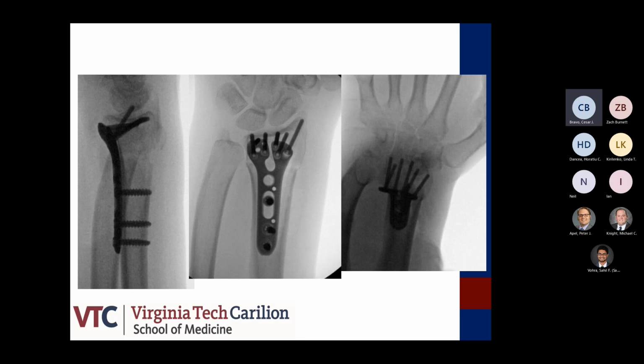Yeah, and the other thing is, if you look at that center hole screw, the locking screw there, I do put that locking screw. There's actually 2 biomechanical studies that look when they've got that metaphyseal diaphyseal comminution, just to put the locking screw, even if you get a unicortical fixation because of the dorsal comminution, because the stresses with this plate, because it's a leaf plate, are pretty significant there. So if you've got a significant amount of comminution and there's any toggle, that's where that's going to fail. So I always fill that locking screw, because I've had it fail, and the few non-unions that I've had with this plate are the ones that didn't use that fixation. Just food for thought.